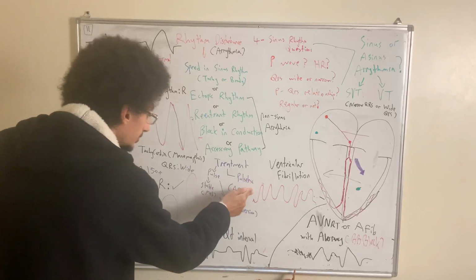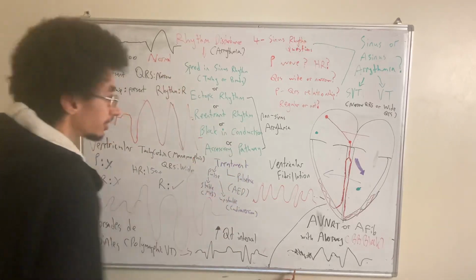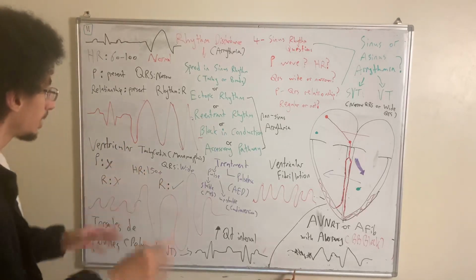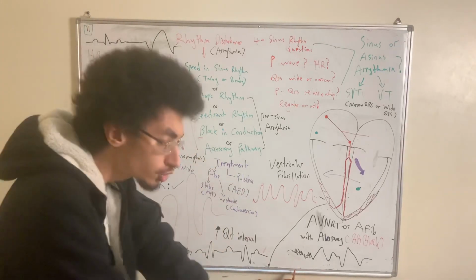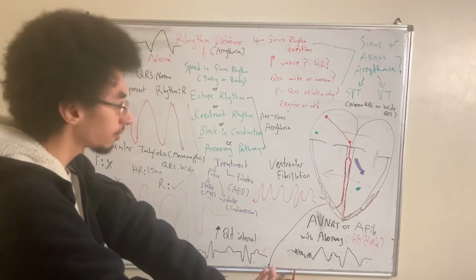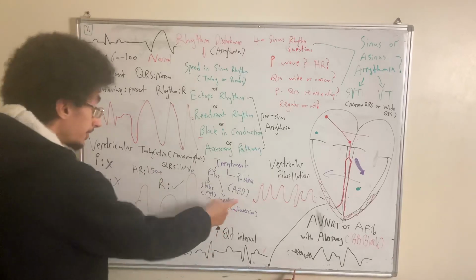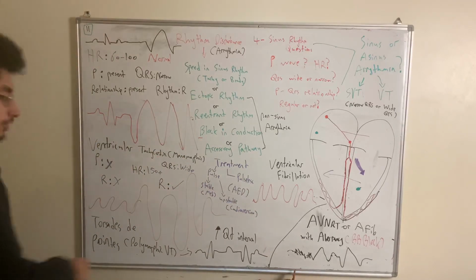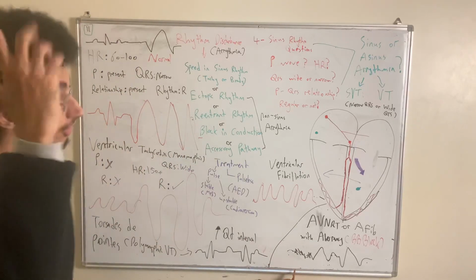Does this patient have a pulse or does he not have a pulse? If the patient doesn't have a pulse, meaning when he assesses the carotid, he has no pulse, but there is ventricular tachycardia, I will immediately shock the patient. Give him a shock, then continue CPR, around every 2 minutes. You might give this patient epinephrine along with it. So, when you have a patient who has ventricular tachycardia but no pulse, you give this patient a shock from the defibrillator machine, the same machine that was showing you the rhythm tracing, then continue with CPR until this patient regains consciousness.